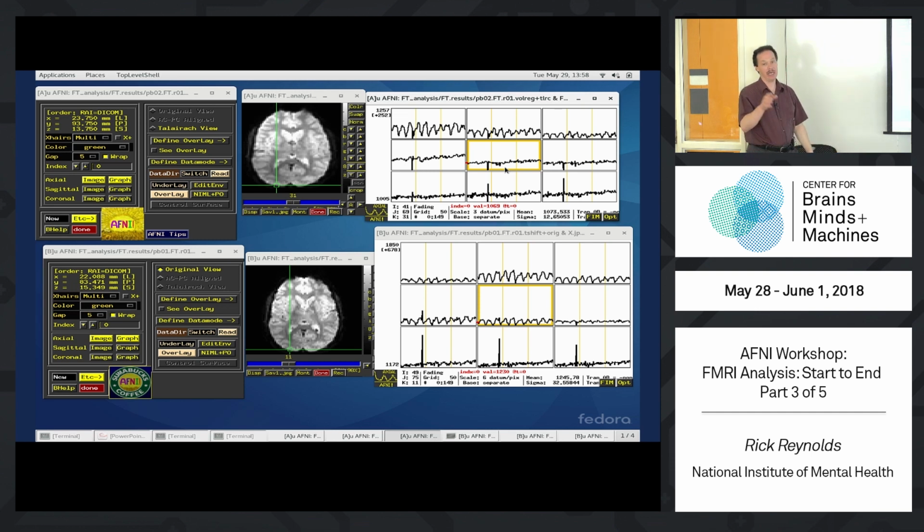But at the command line, you can enter multiple directories. So if we had typed AFNI space dot for this directory and ~abin, then we'd have both directories in AFNI, and we could actually look at the combination. And with the combination, we could include all those data sets right in the display.